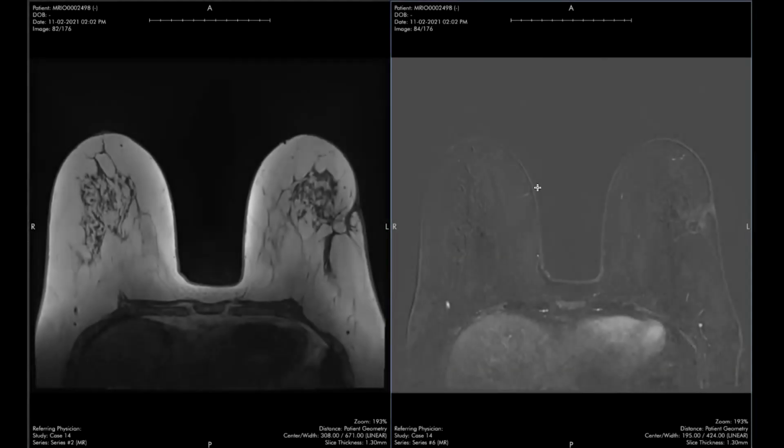As important as it is to talk about the findings that are appropriate to give a BI-RADS 3, I also just wanted to point out that we want to be clear when there are findings that are safe to call a BI-RADS 2 and to let that patient go a whole year before additional imaging. I thought this was a good example because it follows from those post-trauma, post-surgical cases that I showed on mammogram or ultrasound. This is a patient who had a lumpectomy in her left breast, and we see a very classic appearance of fat necrosis.